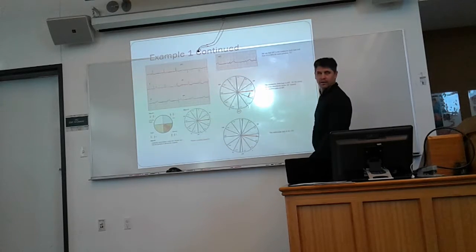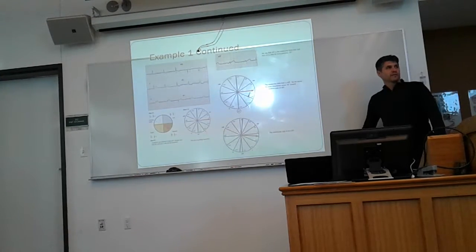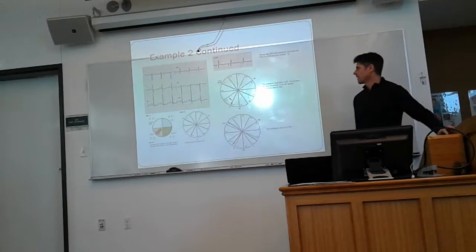So then is this now labeled as a normal 5 degree? Yep. Normal axis at 5 degrees. Normal axis. And when you put the variation like plus or minus 10... Yep. And you don't have to do that because I'll do that.